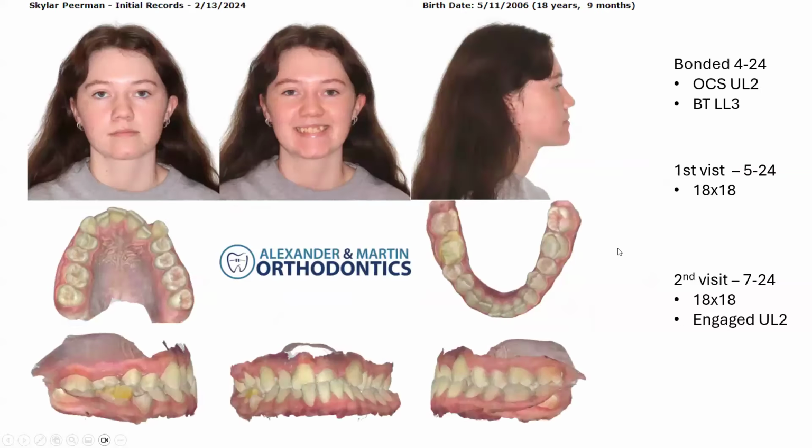And then just to summarize here before we go back to questions, I'm just blown away by what we're able to see. So here's a patient that came into our office. She had records taken February of last year, so about a year ago. She didn't get started for another 2 months after that. She had been in treatment with a general dentist using removable appliances, and these big globs you see on the lower sixes are bite turbos they were trying to disarticulate her with, trying to fix this crossbite. And I guess they'd been working on it for 3 years.